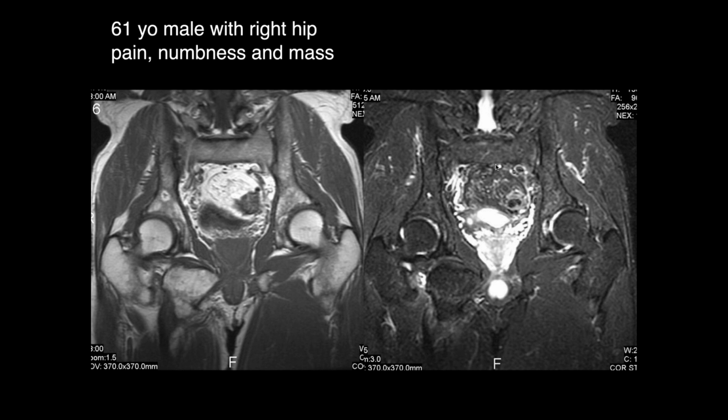Just a second. Ischiofemoral impingement is almost exclusively in females. The reason for that is that the female pelvis tends to be wider anatomically than the male pelvis, and that narrows the distance between the femur and the ischium. So you're primarily concerned about that in females. And now let's go to this case. What do you see on this case, Michael?